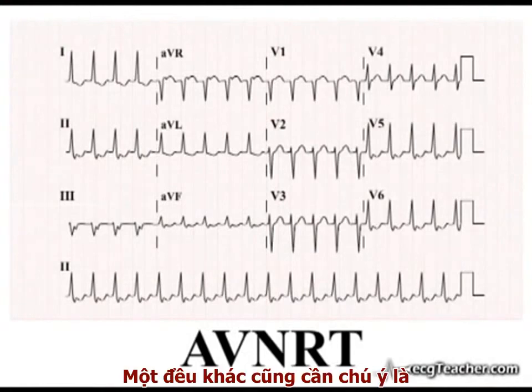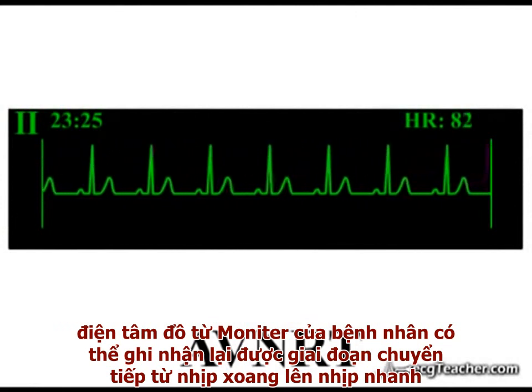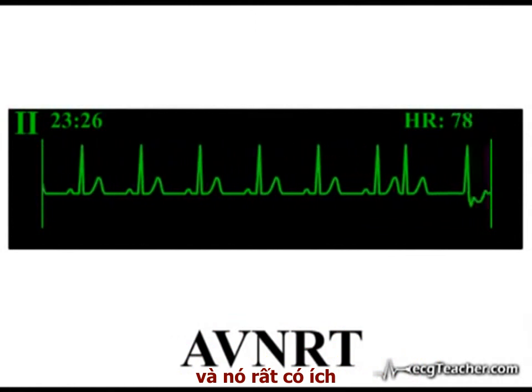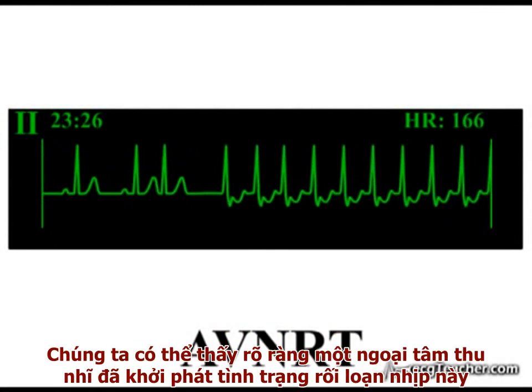It is also worth noting that the readout from the patient's monitor captured the moment of transition from sinus rhythm to tachycardia and is very telling. Freezing at this point, we can clearly identify the premature atrial ectopic which triggered the arrhythmia.